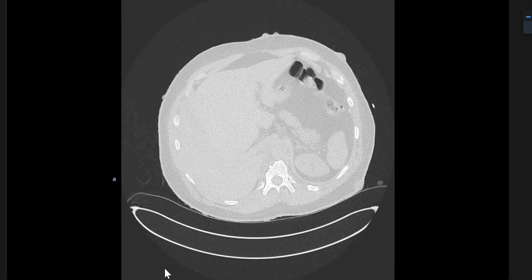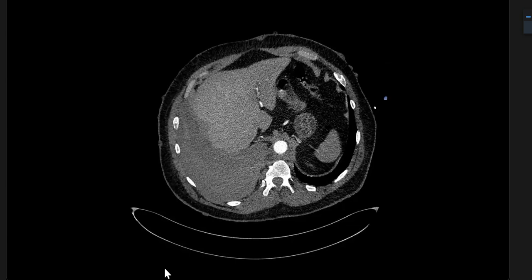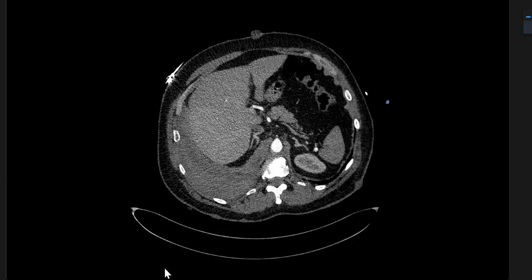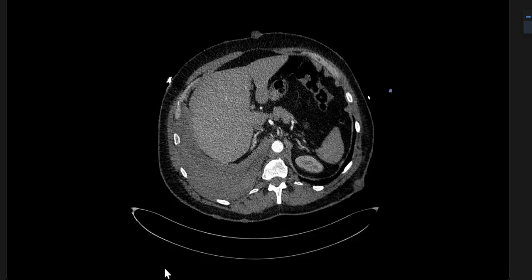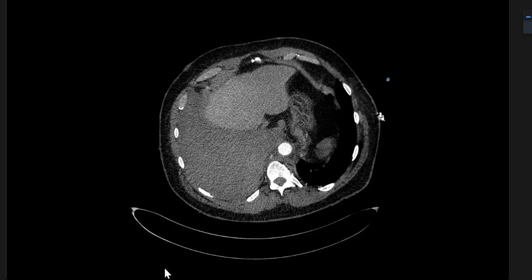Okay. There you go. This is not... There is multiple. So it is not scrollable. No, it is scrollable. There is multiple small soft tissue.